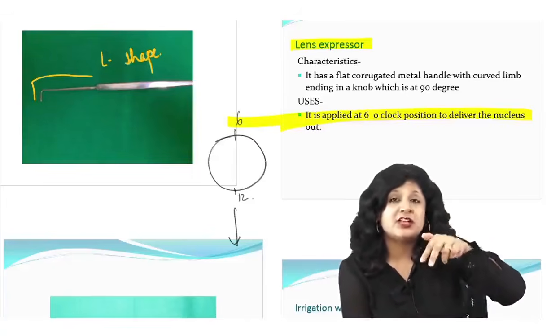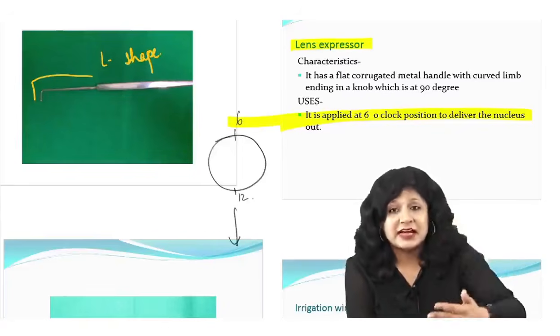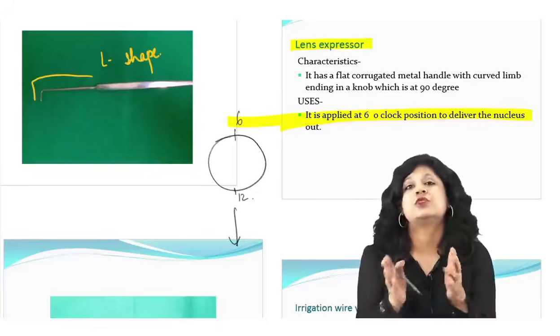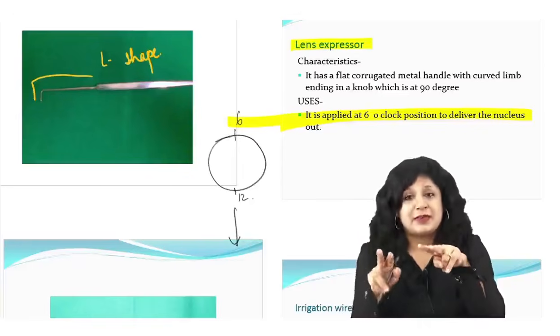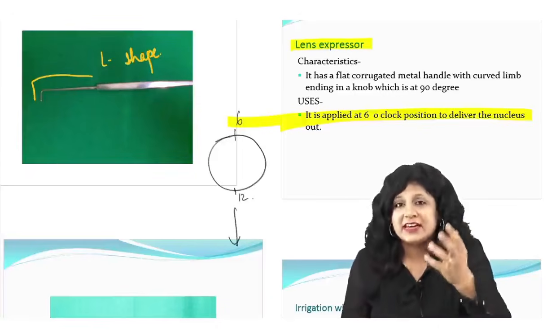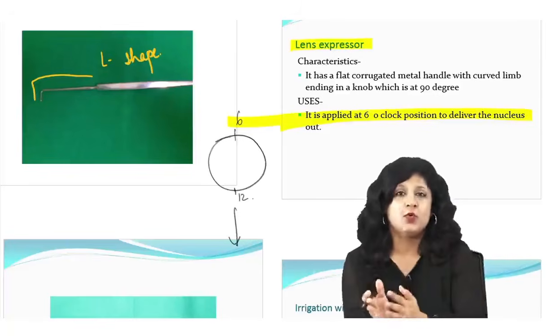We will be matching up all the steps of the cataract surgery while we are dealing with the instruments. You have given the incision, then cauterization, then you have made the gutter, the tunnel, and now we are coming to the nucleus delivery. I will show you the instrument that will be used for your hydrodissection and the hydrodelineation. We have seen the suture tying like Macpherson's forceps, that was also there. Then anterior capsulotomy you are doing with the help of cystitome. So I think now when you read the cataract surgery steps again, it will be easier for you to correlate how this will go on, right?